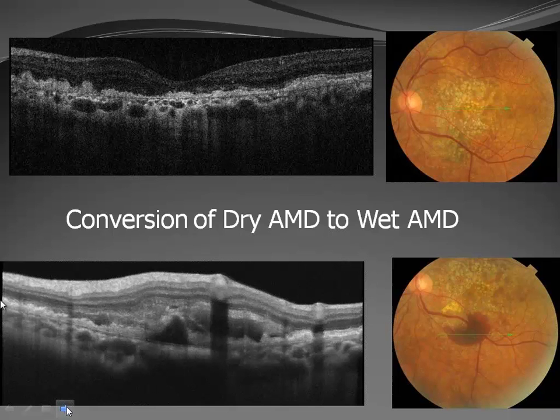So here's a patient above that had those sort of cuticular drusen that we talked about before that looked like they were, in a sense, eating through the retina. They were infiltrative as well. And then this patient developed a bleed, choroidal neovascularization, with blood and with some exudates, as you'll see in a moment. The patient was unaware of it because it didn't occur in the central 5 degrees. So completely unaware of it, just came back for this patient's routine 3-month exam. And sure enough, the patient has wet mac degen.